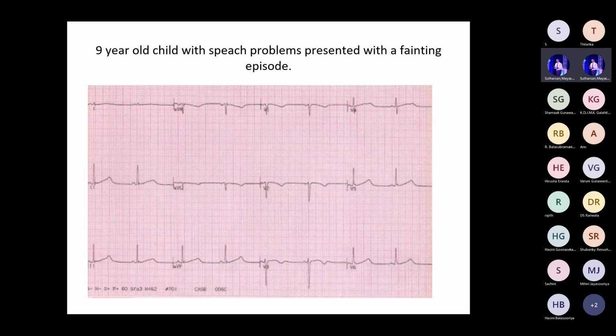This is interesting. A 9-year-old boy with speech problems presented with a fainting episode. Can anybody tell, who are online? Fainting episodes, speech problems. What does the ECG show? Anybody online? Short PR.